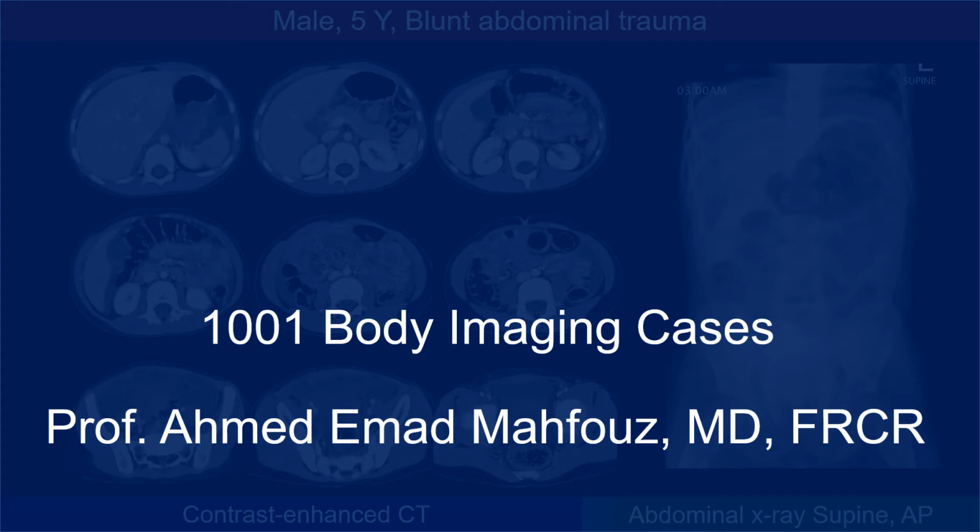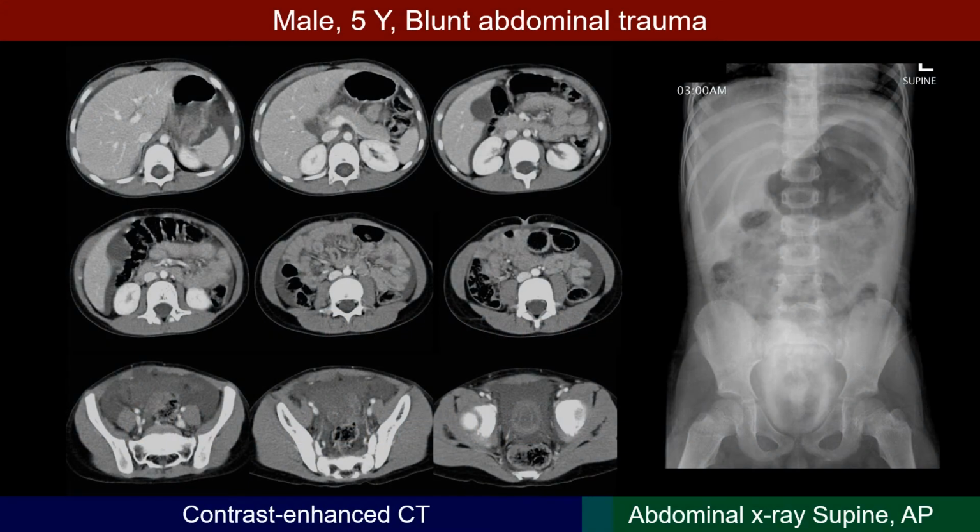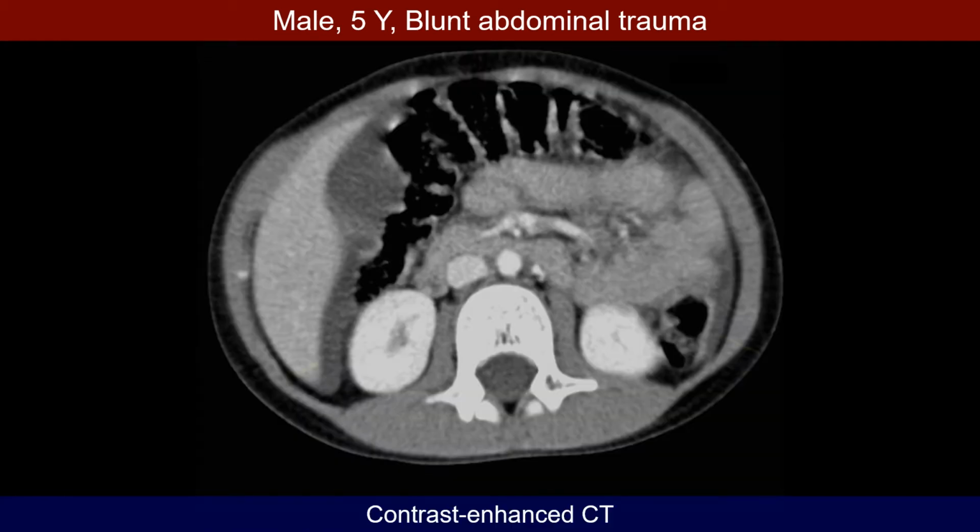Welcome to the body imaging cases. This is a case of a 5-year-old male with blunt abdominal trauma. There is free intraperitoneal fluid.